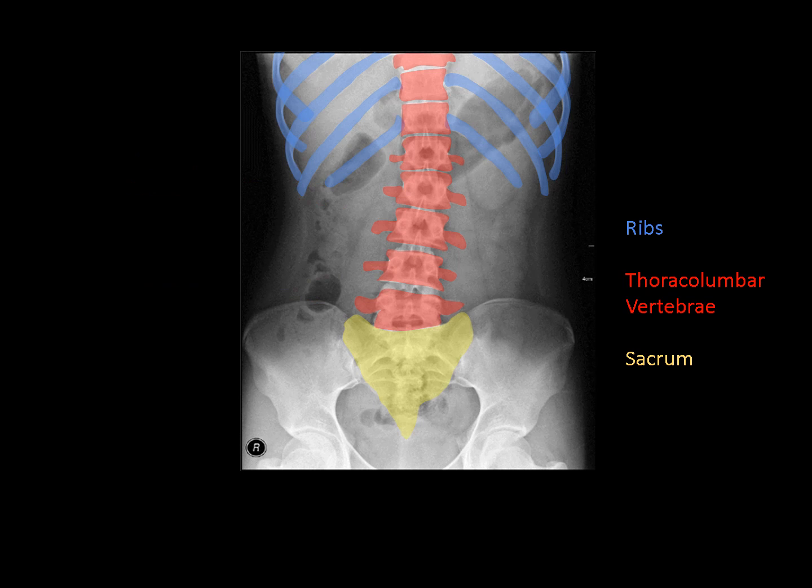Moving more inferiorly, we come to the sacrum. And in the sacrum, you can see these paired structures bilaterally. Just a few are labeled here, but you can see more as you move more inferiorly in the sacrum. And those are your sacral foramina. So those are the foramina where your nerve roots will exit the spinal canal on their way out of the sacrum.